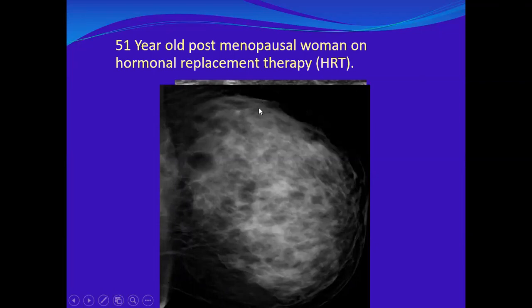Where is the mass? Small, very small. Here? Yes. This one? Yes. Other suggestion? No, this is not the one. Look carefully. You can see it?